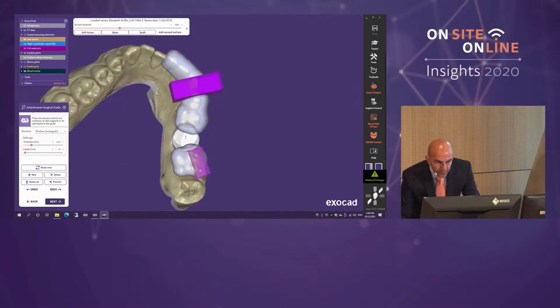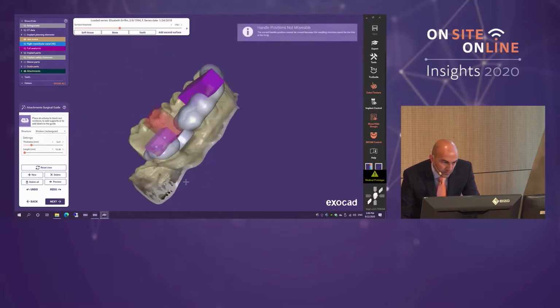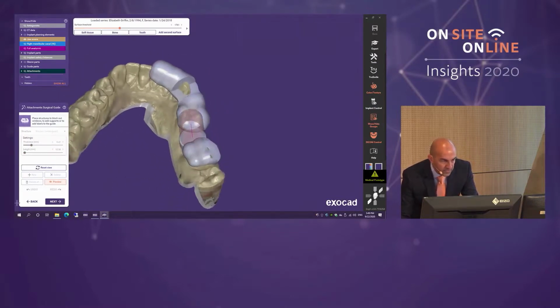Now, shortly what we're going to do is we're going to turn to our colleague over there, that's Udo at the 3D printer. And since we've been milling today, we are also going to be printing as well. So let's have a preview of that. So there you go, we've got a little window on the 7, we've got a bigger window anteriorly.